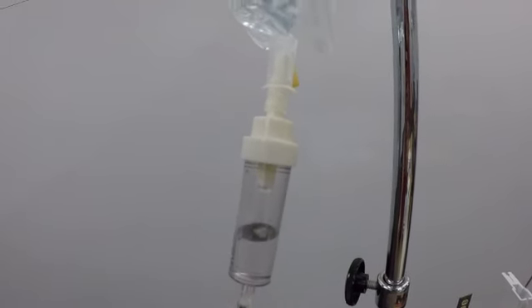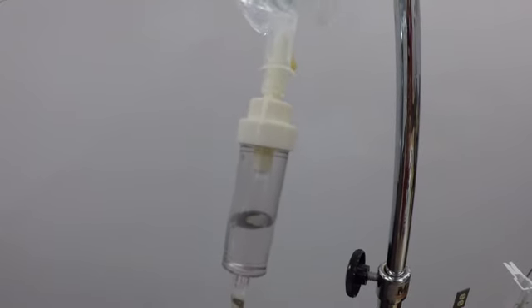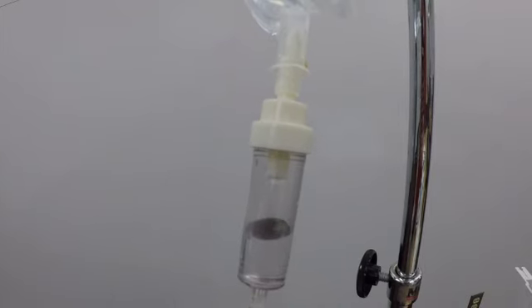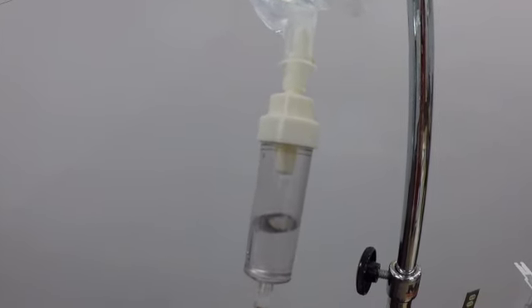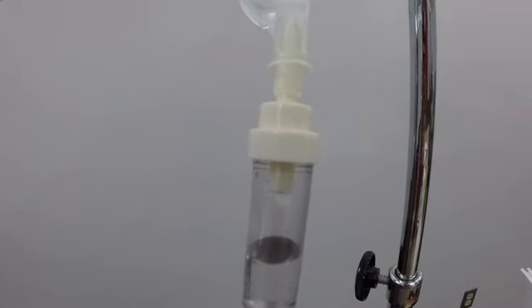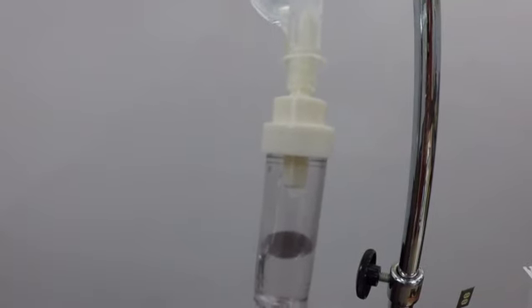So if I open this up, you can see that's kind of like a waterfall or a sink running. And then maybe I get my liter in and they look a little better, so I don't want to give them as much anymore, so I'm going to cut it back maybe to KVO, or we'll do a drop over 10 seconds. Or maybe I'm going to give a medication and a patient has hypertension. I don't want to give them a lot of fluid, but I want to be able to control the medication, and so I'm going to give it to them.